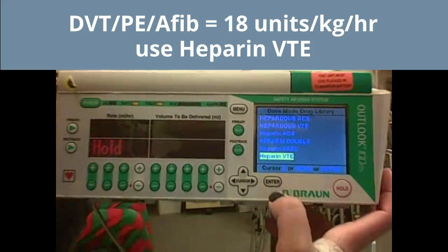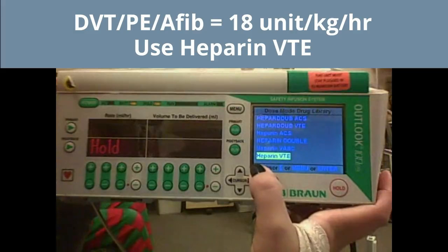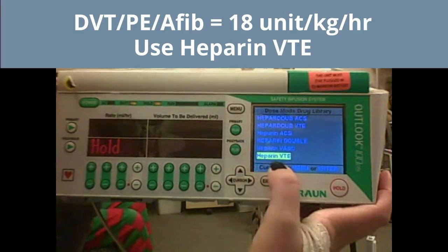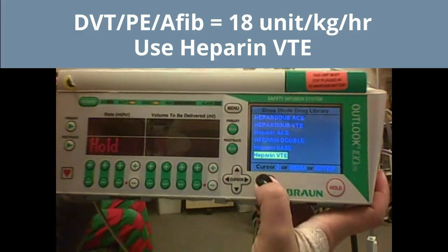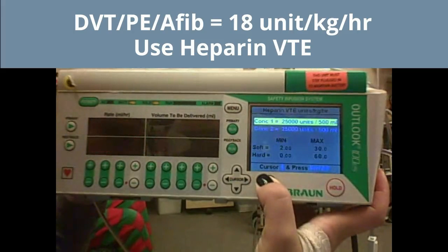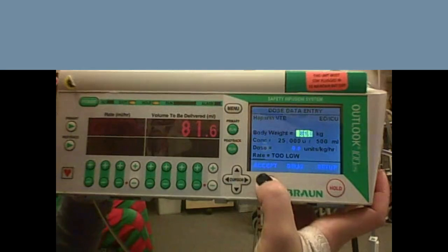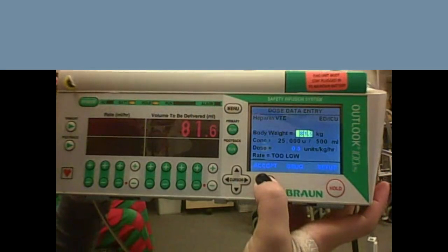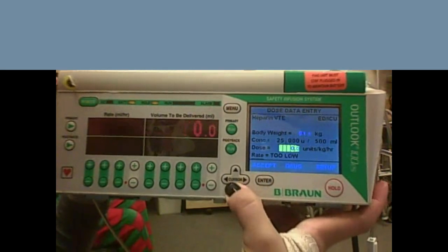In your pump, heparin, Afib, PE, DVT, and general is going to be your 18 units per kg per hour, and that's going to be the heparin VTE in your pump. Going to remind you of your second RN check, 25,000 units in 500 mLs. And then it's going to ask for your patient's weight, and this patient's weight, we said, was 81.6 kilograms.